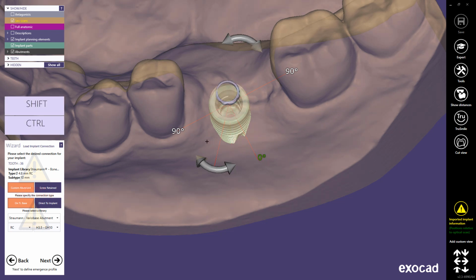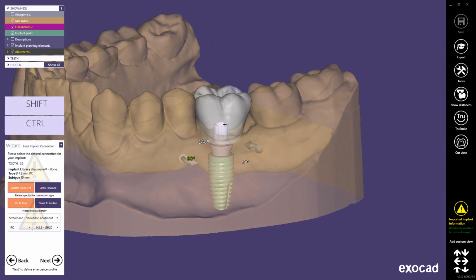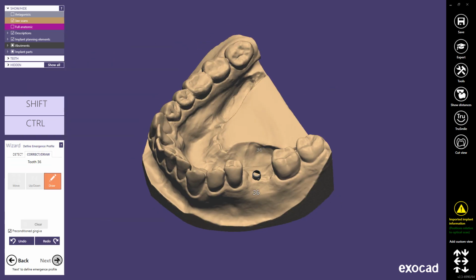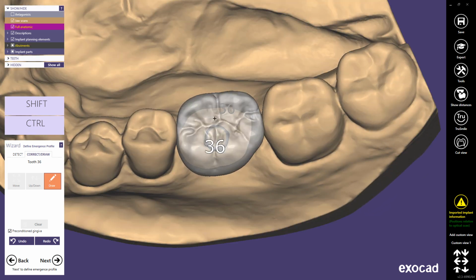And now you have the ability to rotate the T-base in your implant. In this case, we have a square-shaped interface, therefore we can only rotate it in 90-degree steps. A hexagon, for example, would allow you to rotate it with 60 degrees. The following work steps are exactly the same as in the normal custom abutment workflow. This will be shown in a separate tutorial.